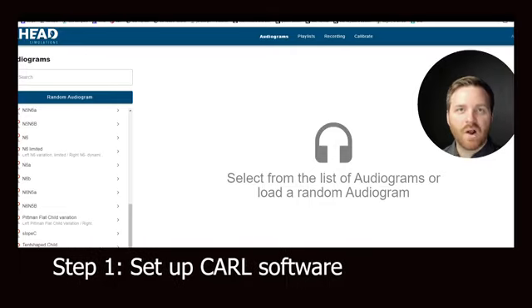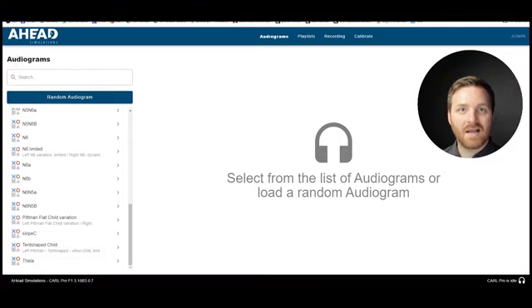The newest release of CARL Pro can connect to your computer via Wi-Fi. If you're using your Wi-Fi to access Theta, you can connect CARL Pro to your computer through an Ethernet port on the back. If you have an earlier version of the CARL Pro unit, you'll need to connect the CARL Pro to the laptop that it came with, and then run Theta separately on a different device.